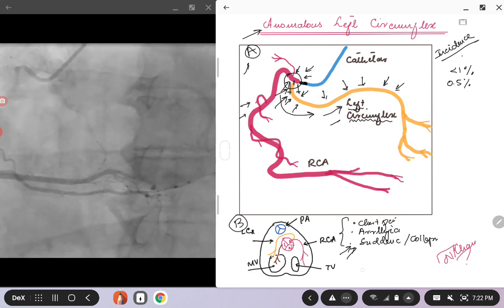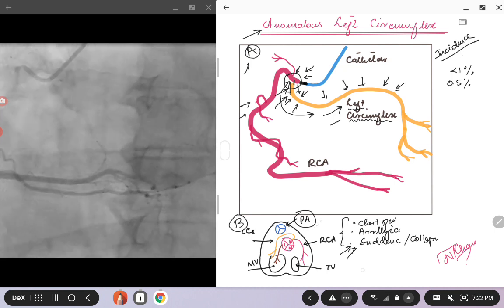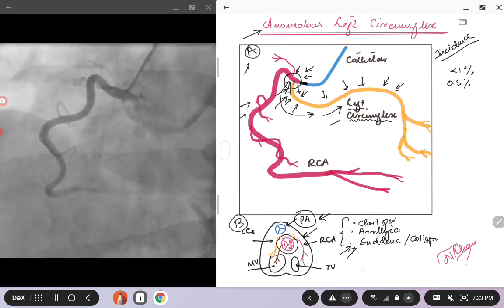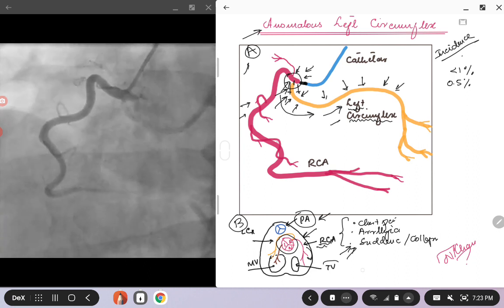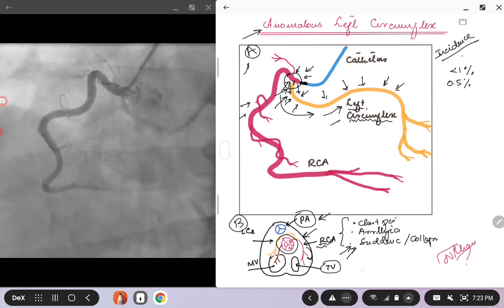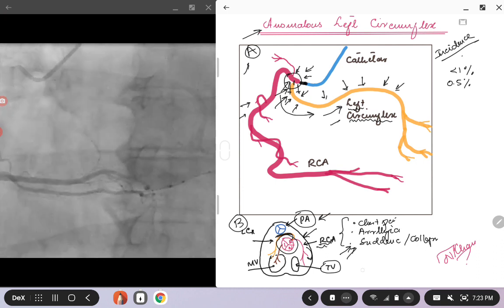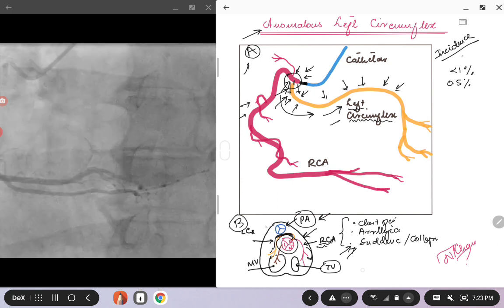finding. I want you to pay attention here to the blue. This is your pulmonary artery, and then in the red I have shown the aortic cusp. You can see the right coronary artery arising from the right cusp and then going on supplying the right ventricle. This is the tricuspid valve here. In some patients, this left circumflex has to take, as we talked about, a different anatomical course, so it might go in between the pulmonary artery and the aorta.